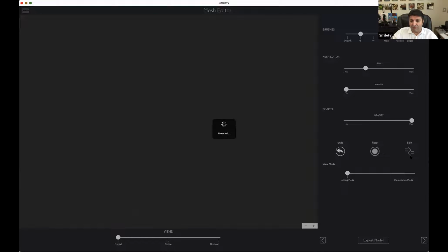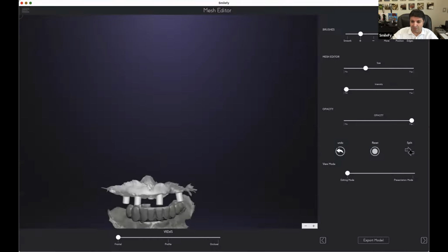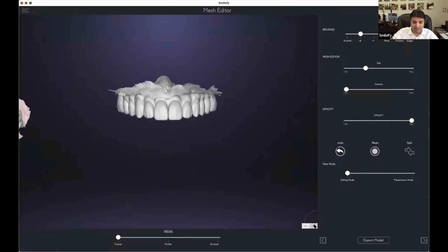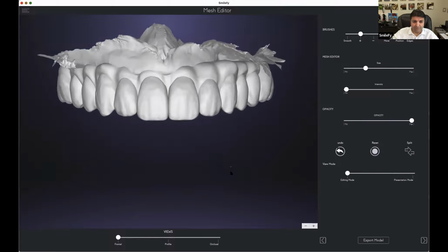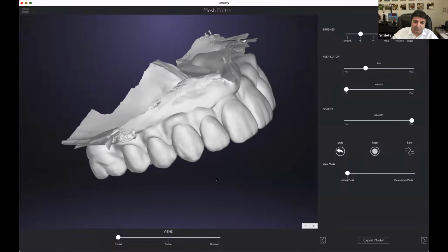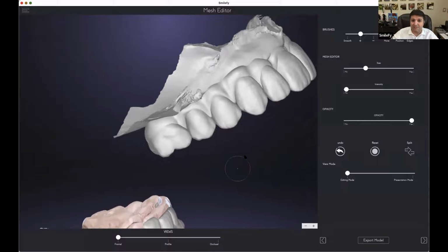And here we do have the option to readjust the gums, of course. And I'm going to show you how easy everything actually is. So let's go with the uppers. Okay. Zoom in. See, everything is white. We're going to work on the colors. That's, I promise. So what we have here is very easy and cool.